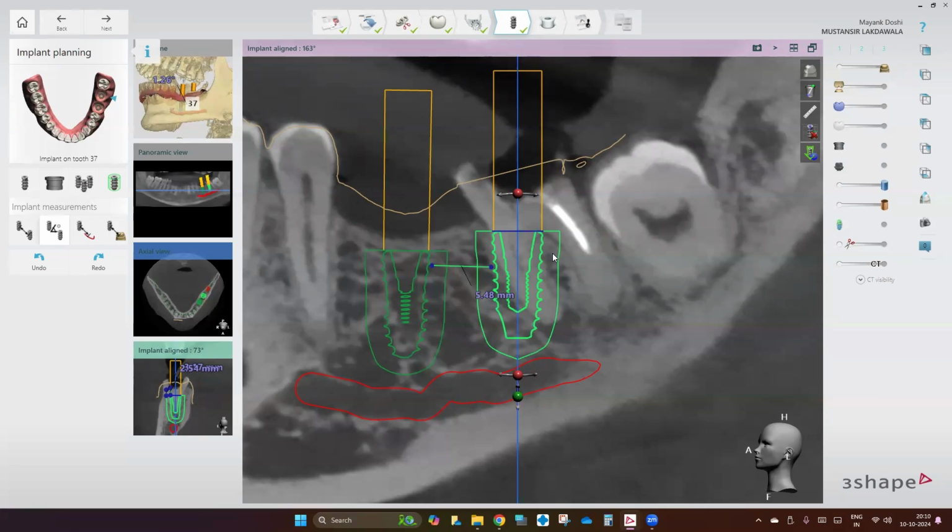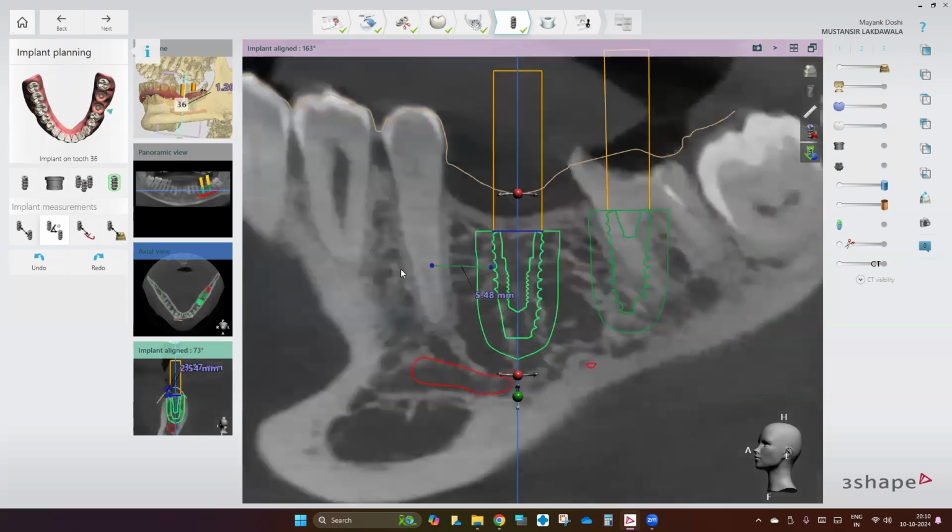Like here, if we consider implant at number 6, I guess 3 6, so it is advisable that after removing the guide, we can give our final torque over there. For 7, the doctor has to compulsorily place the implant through the guide. For 6, if at all they decide, there is no logic of putting it. It has got recorded also. I will share it with you guys just in case you want to refer to it.